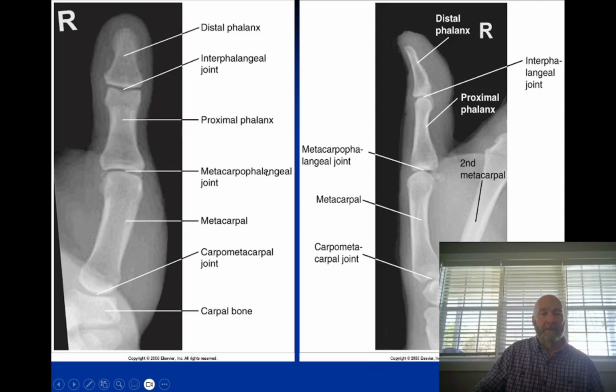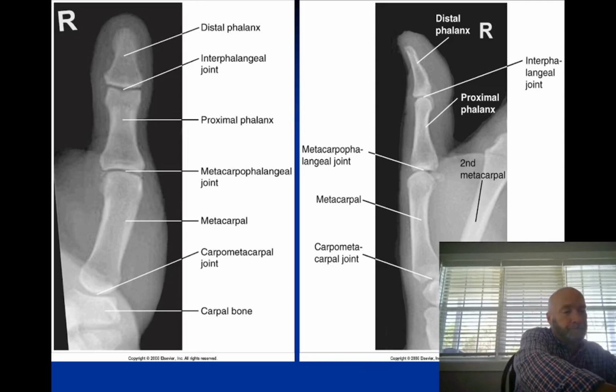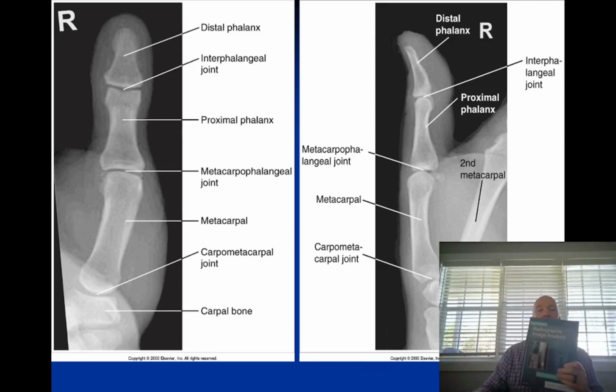Likewise, on the DR cassettes, what you want is as close a collimation as possible. They could have collimated a little bit more on these, but you want as close a collimation as possible. The reason for that is because your DR systems are reading your entire radiation field. So let's say you're making an exposure on an image receptor, and this is your digit. If you include the entire image receptor, then it's got to read all of that information.